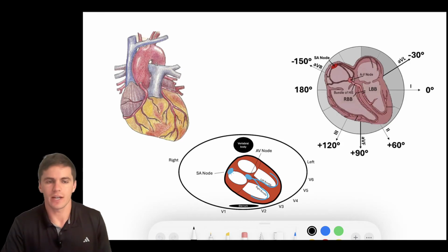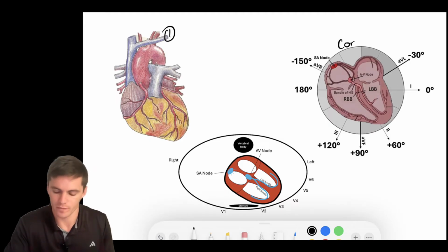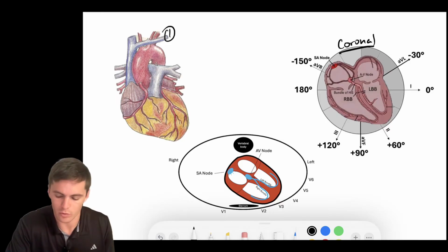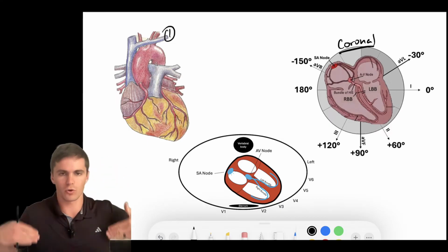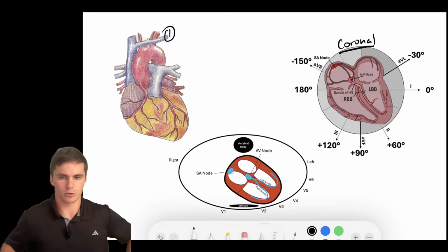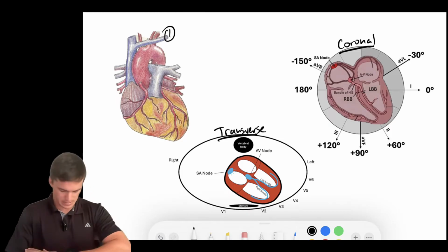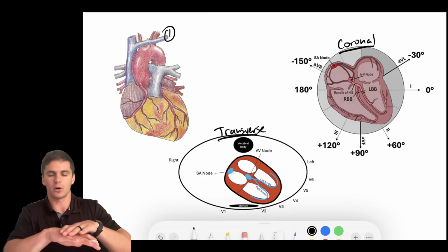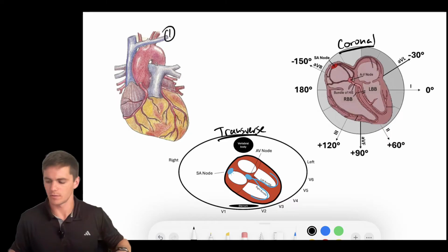Alrighty, so here we have three diagrams. We have just our coronary anatomy diagram here, diagram 1. We have our coronal view of the heart, which coronal, remember, is slicing my body this way. So coronal will represent horizontal changes in voltage and inferior, superior changes in voltage. And then you have the transverse, which is essentially cutting me right here, through the chest, in a horizontal plane, right? So that measures forces going anterior, posterior, and lateral as well along that plane that's created, okay?